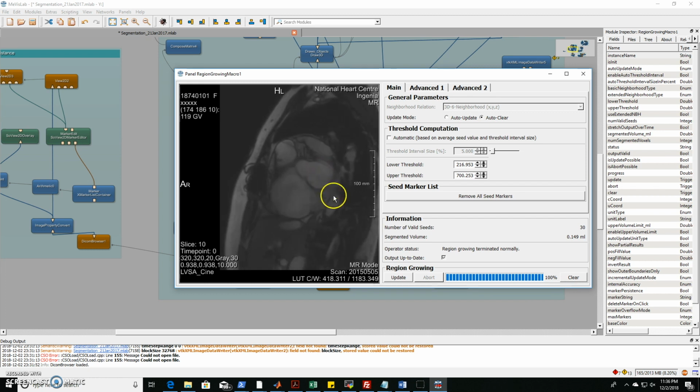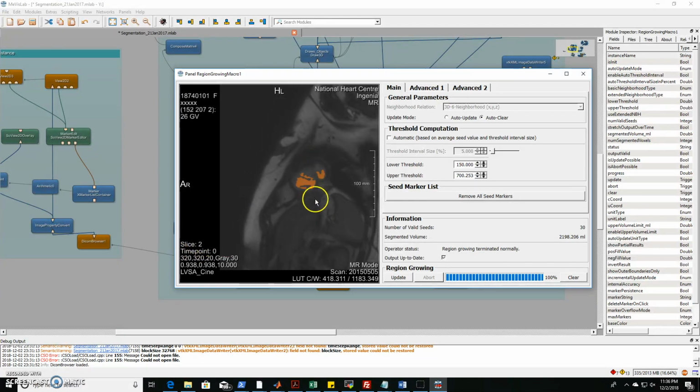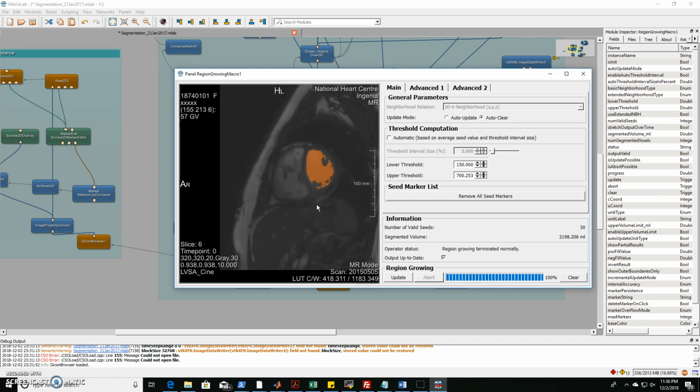Here it didn't work, or it didn't segment anything because it didn't pick anything up. So if you lower this threshold right here, say to 150, and update, you can see the volumes increasing and it's segmenting automatically. It looks like that's done. You can see I'm staying at time point 0, and if I move down the slices right here, you can see that it automatically projected downward.